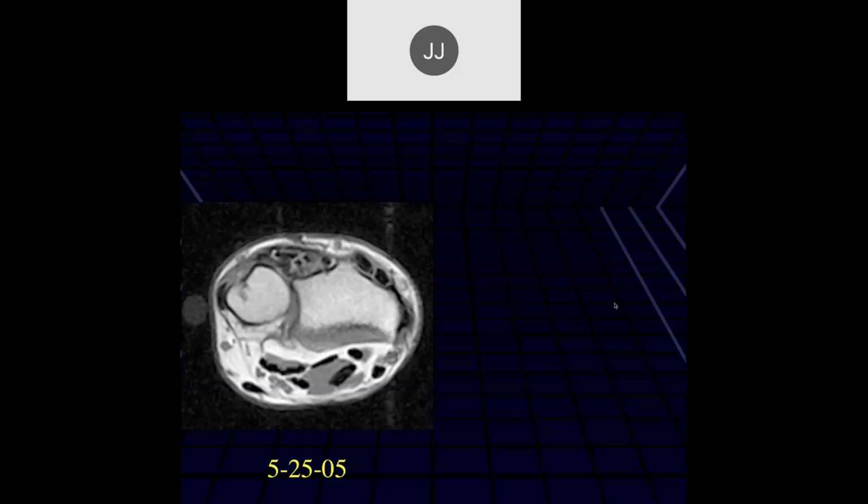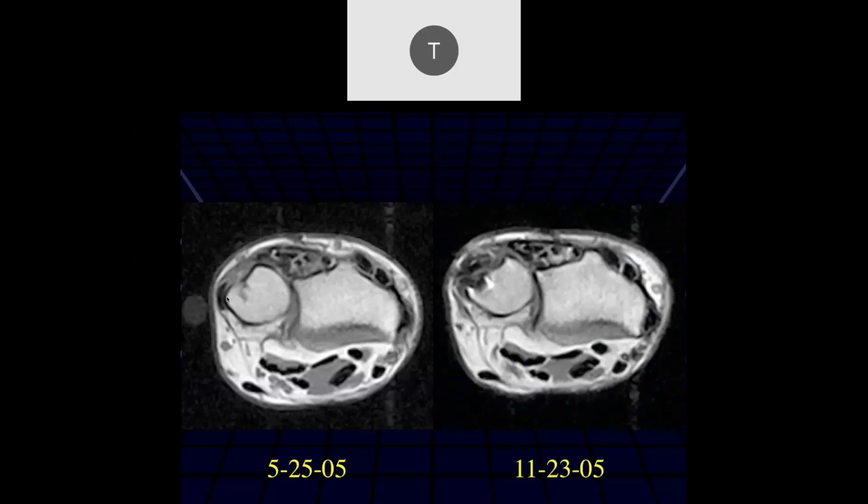Tayson. So the extensor carpi ulnaris is subluxed ulnar and flattened over the distal ulna there. All right, so some susceptibility artifact. Yeah, maybe it was operated on as well. Tenodesis. Yeah, artifact. This looks like a tenodesis.